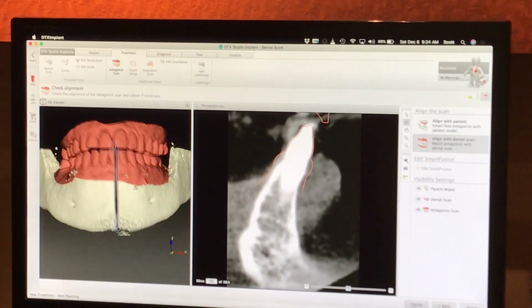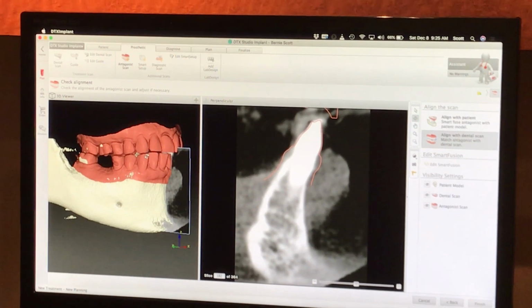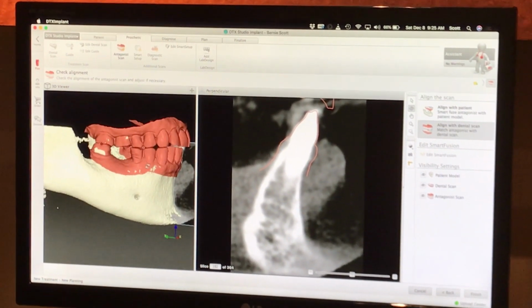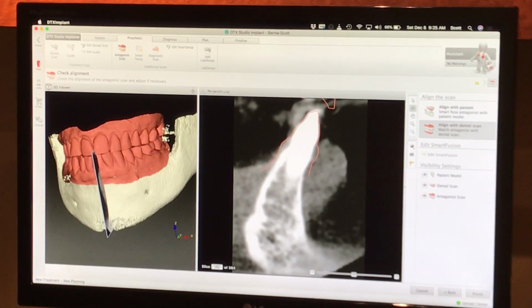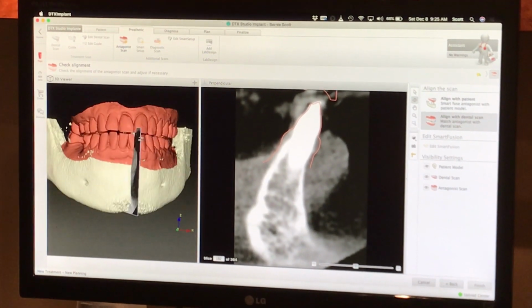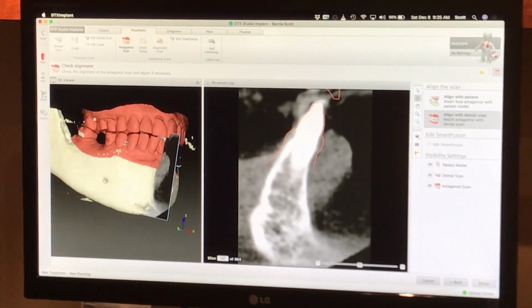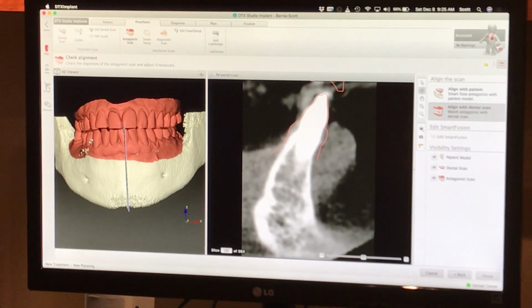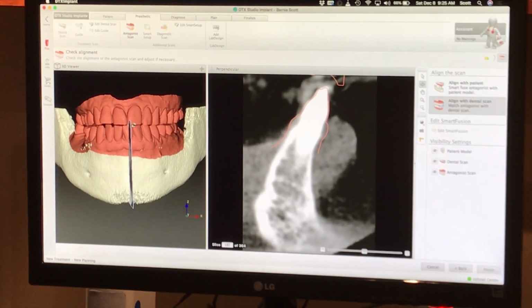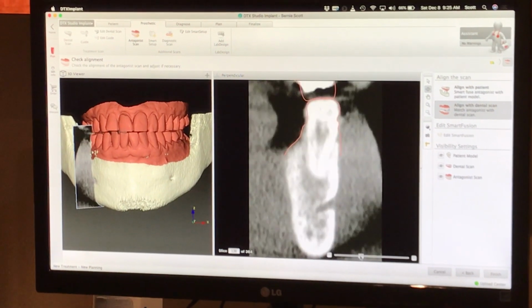So when we sent it to be processed, you can see he has an anterior open bite. We'll see if that's actually accurate when we look at him today. This tells me he's got a little bit of joint problem if he has that. Okay? And he has flat teeth, he does not have canine guidance, so he probably has a flat articular eminence in this case. So he's going to have a lot of posterior wear and a lot of function. So our goal now is to plan with this. You see how the window stops at the edge of the teeth. So the area of interest is really just where we're looking here.